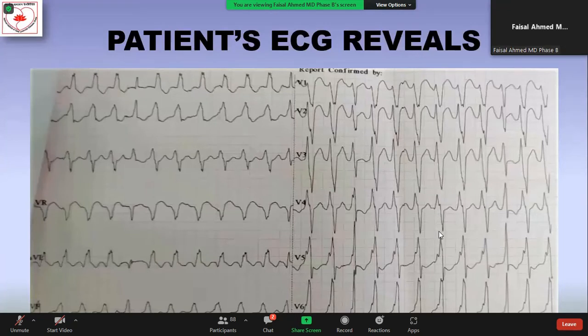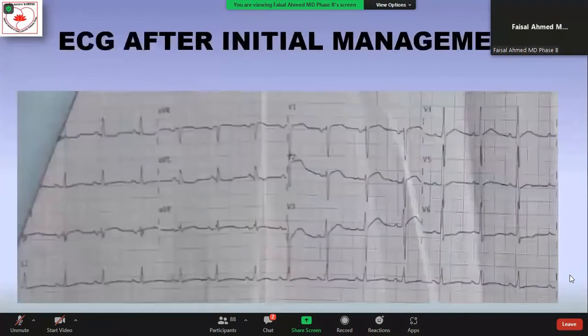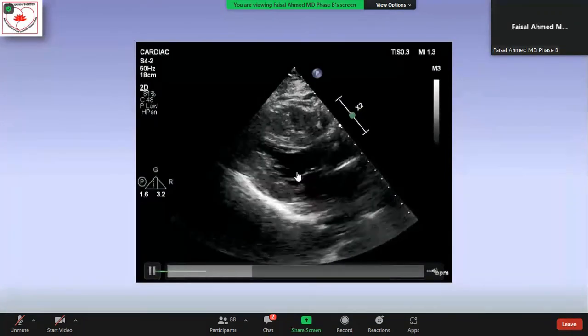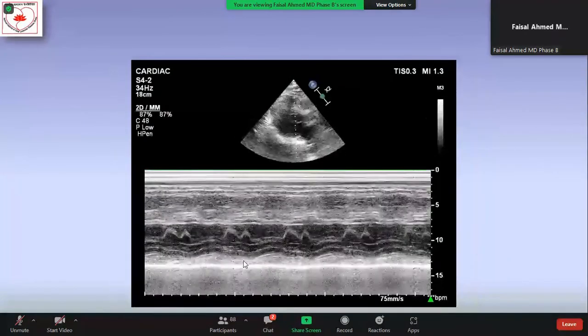Probably you misheard me, because I said that there is absence of any systolic anterior motion in my echo imaging. I'm letting you see that. This is the PLAX view and it shows that there is no systolic anterior motion from the AML. And also there is an M mode. There is clear separation of the AML during ventricular systole. So there is absence of SAM, and actually in the obstructive variety, the SAM is usually present with an increased LVOT gradient.